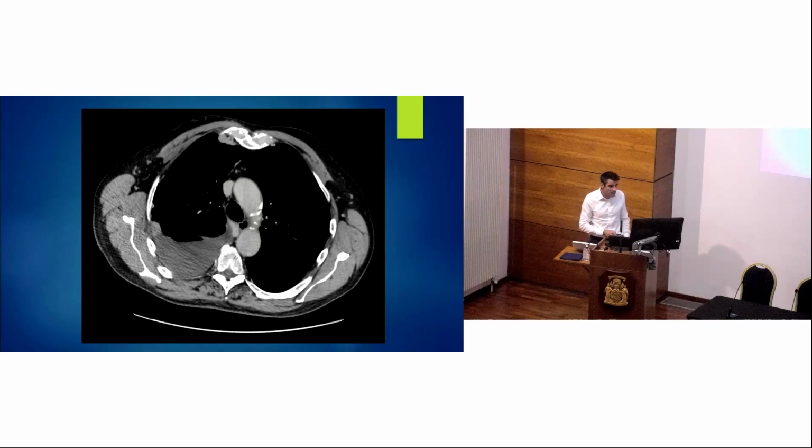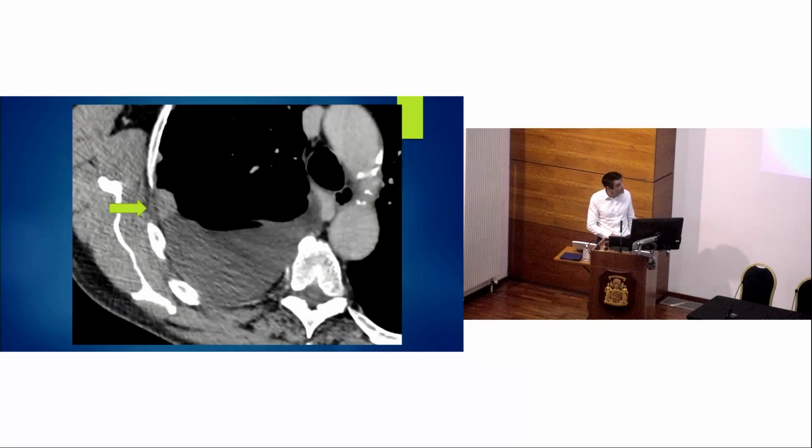This is another example of T1 disease, this time again, pleural effusion. And here's a more solid, a larger lump of tissue, a larger lump of tumour. It's still T1 disease. And we can see there, because if we do the close-up, we can still see the subpleural fat is preserved. And so this is confined probably to pleura alone.